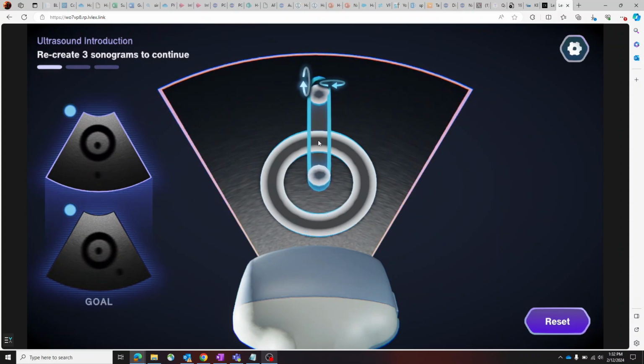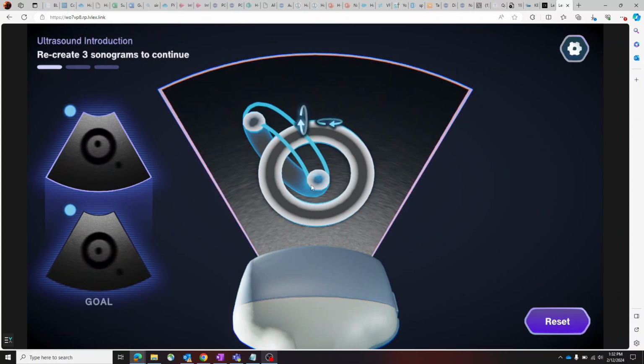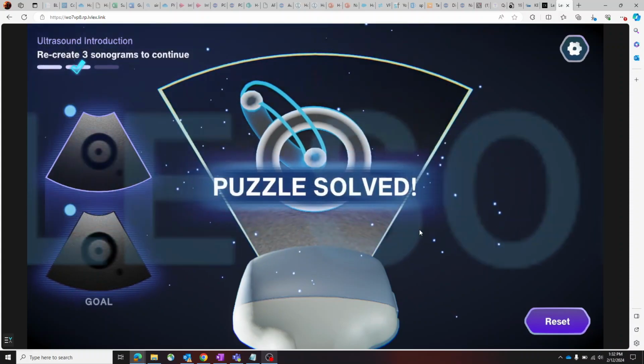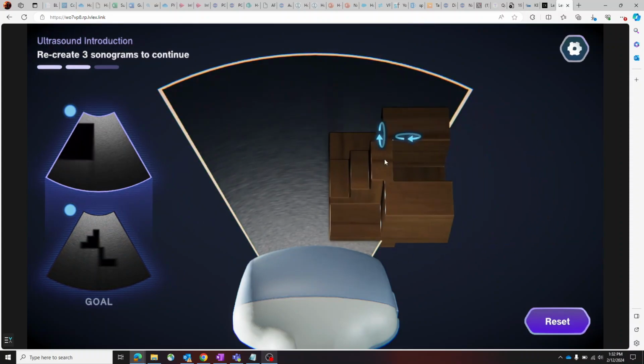Obviously, we have the ability to add additional modules to this as well, just continuing to iterate over this. What we really liked about these was the landmark mapping. The shapes that we've chosen here are all shapes that we are familiar with and that we understand the landmarks of. Looking for those landmarks and then coming up with familiar shapes was one of the goals here.